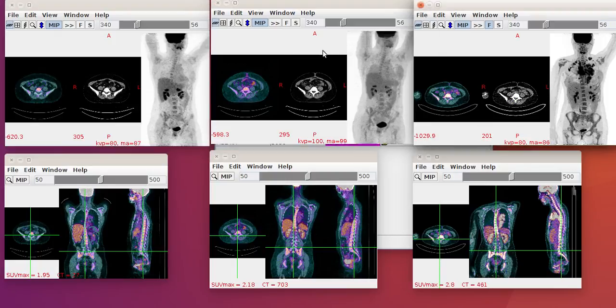Okay, now I've got my things correlated. I want to save those correlations so they don't get lost. I press on the up-down keys to save everything. Now let's pretend I want to do an analysis of the study.